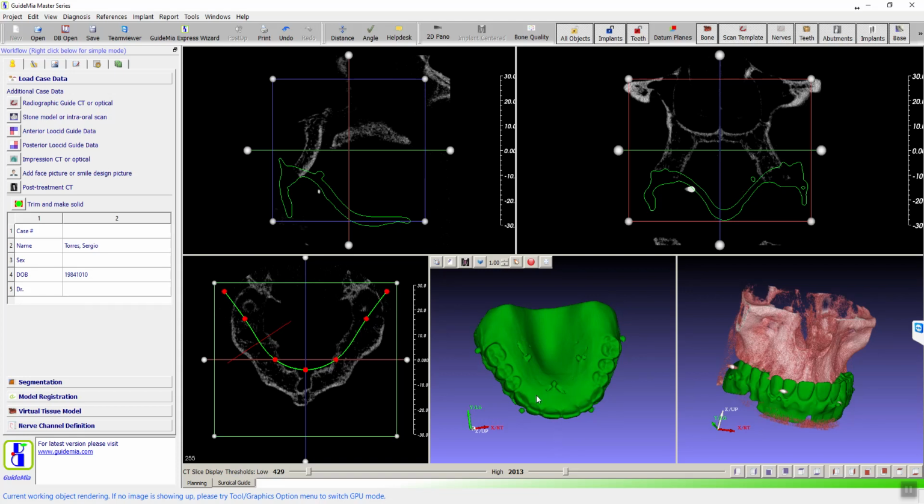Oh, I see what you're saying. Okay. So the software doesn't recognize it. Right, from the left it's flipped. It is flipped here, so we're going to fix that. So no worry.